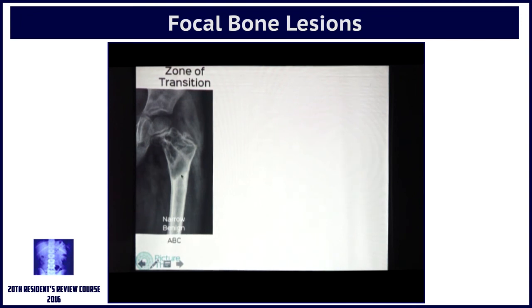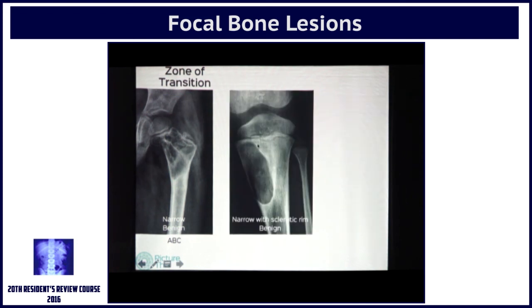This is an aneurysmal bone cyst in an immature skeleton. But if you see a sclerotic rim, that is an even more powerful sign to tell us that we're dealing with a benign lesion, because it takes that much more time for the sclerotic rim to occur. Anybody? What is this? Cortical lesion, immature skeleton. It's cortical and juxtamedullary both.